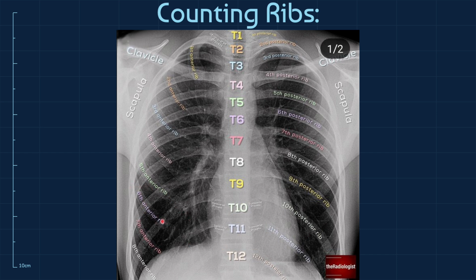So when it comes to everything else, we start with our bones and soft tissue portion. So we would want to look at every single rib and identify if there are any fractures, any cracks or breaks. Always important to follow every single rib down either side. And you can also look at the spine and count the thoracic spines, look at the clavicles, make sure there are no fractures and there's no discontinuation amongst the cortex of the bone. You can also assess for the scapula.